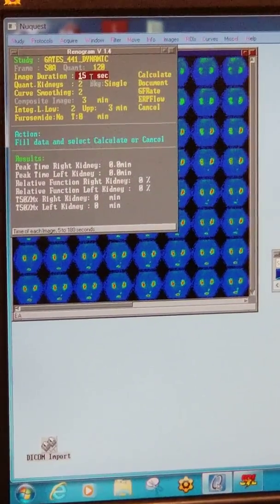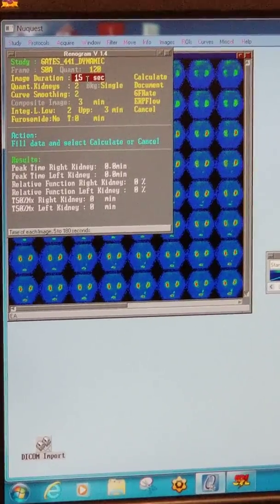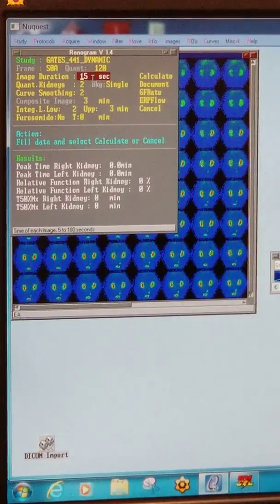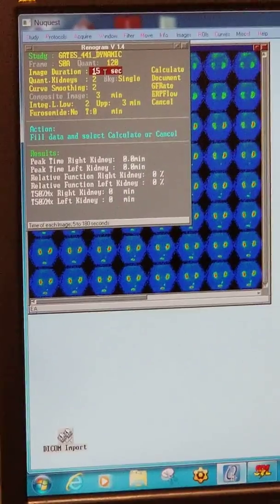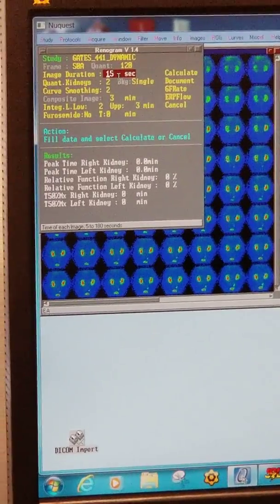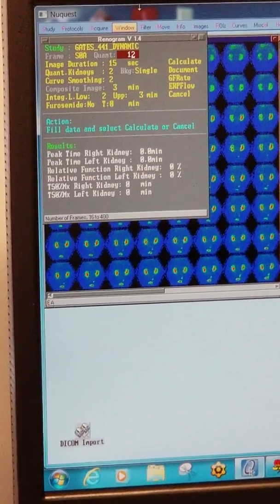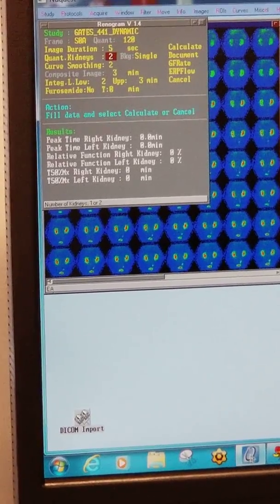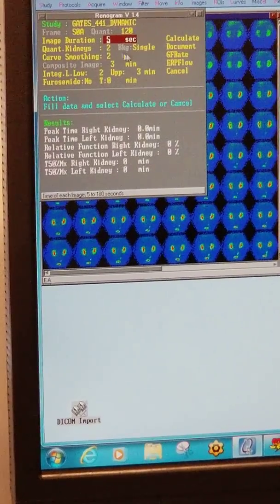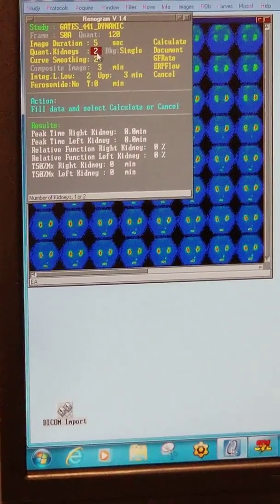You know how when you're processing you take a lot of 1-minute images, but they say they only want to see 5, 10, 15, and you select those? It's kind of the same situation. So here I'm saying I want to look at it every 5 seconds. Ooh, wrong one. Here. 5 seconds. Okay? And you can choose it later, you can play with it.